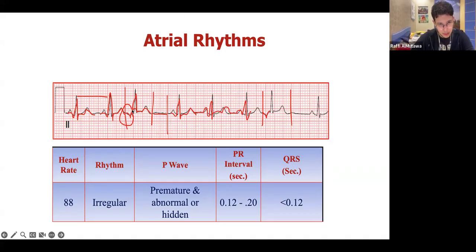But yeah, the point of this is, if you have normal sinus rhythm, but then you look at the PQRST, you get one random abnormal one. You play it, but it resumes in sinus rhythm. Even if you get another one later, as long as you're resuming to sinus rhythm, this contraction, this PQRST, which represents a whole contraction, is abnormal. So we call it premature. And then you look at the morphology, you look at how it looks to decide where it is. So this is atrium. So I hope that's clear.